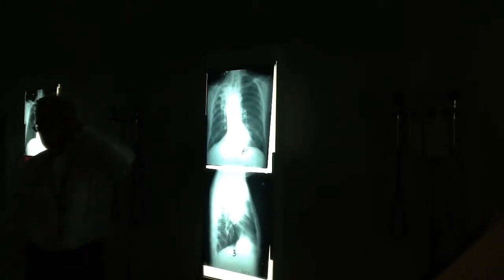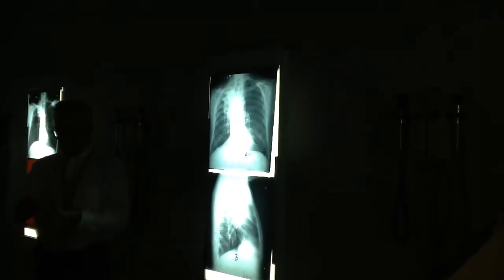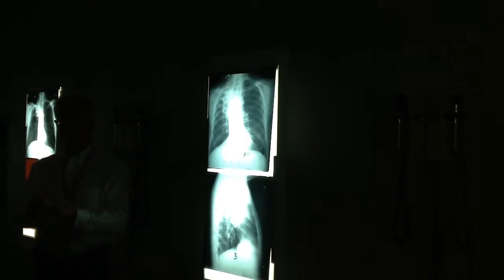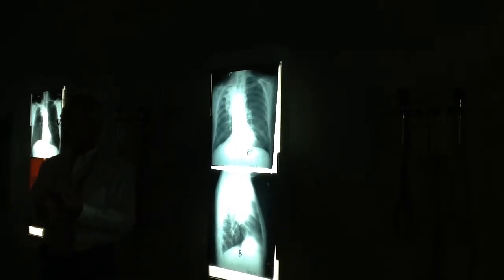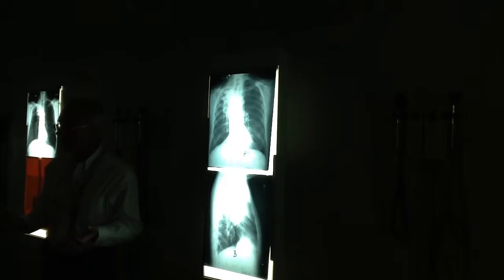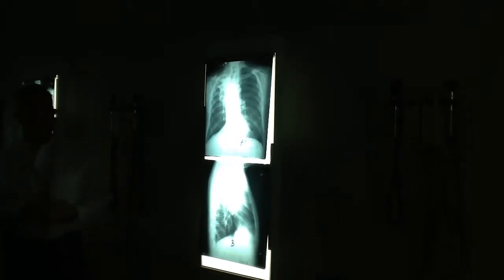Anything move? Because that's always a good question. Trachea. You see, we're dealing with unilateral localized water density, and the hilus. So deviate towards. So unilateral localized water density is the CAT-P considerations. And a great first question is always, well, did anything move? Anything move toward the density? Or away from the density, for that matter? Did anything move is always a good question, a good first question.